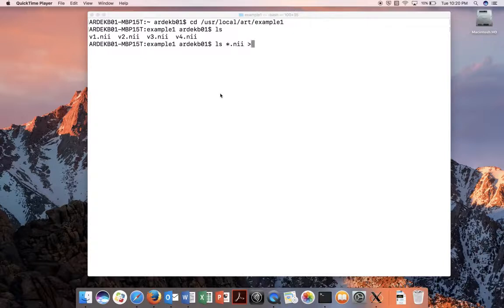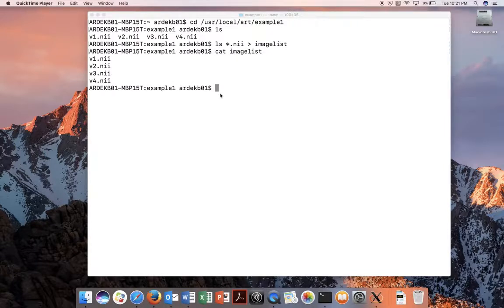Quickly I will create the image list file that is required as an input to ATRA. So let's just look at the image list file. It's simply a list of the 4 images in a text file. Then I can start running ATRA, and as input -I image list is given, and I'm going to put it in the verbose mode using the -v command option.